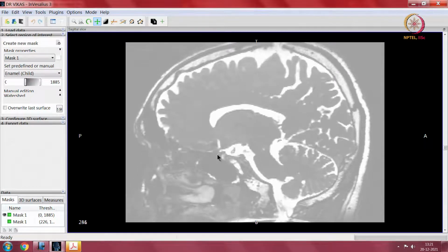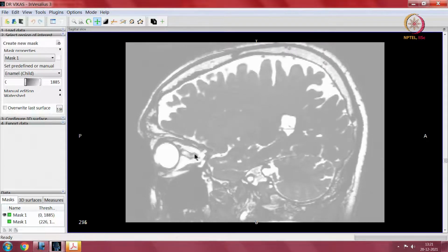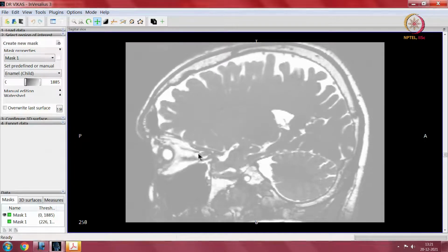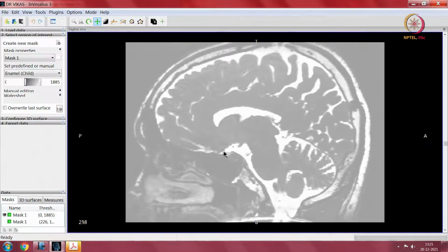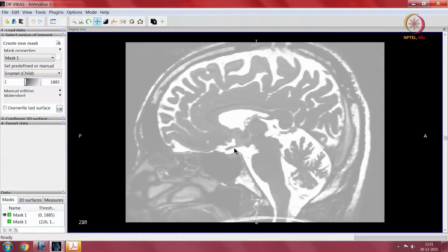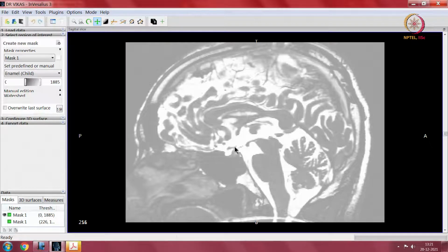We go back to the optic nerve now over here. The optic nerve curves over here, and if we trace it back, it comes back through here, here and here, and that is the optic chiasm. So, these are sectional imaging. You can make out that it is closely related to this region, and that is the region of the hypothalamus. The hypothalamo-pituitary axis is the region of the hypothalamus, and this is the region of the optic nerve.